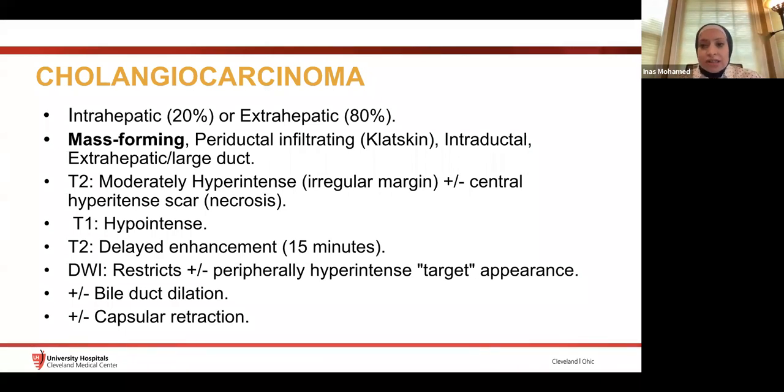And we have the cholangiocarcinoma protocol, which actually goes in the enhancement till 15 minutes. Cholangiocarcinoma is a fibrotic tissue, so much fibrosis that it can stay there, minimally enhancing until very delayed, 15 minutes. Okay. Again, cholangiocarcinoma restricts like crazy because, as you know in physics, restriction is Brownian motion. If it's all fibrotic tissue in there, you lose this Brownian motion.